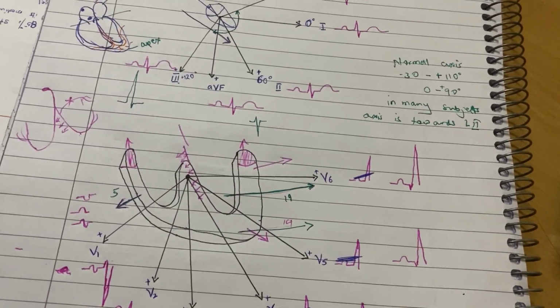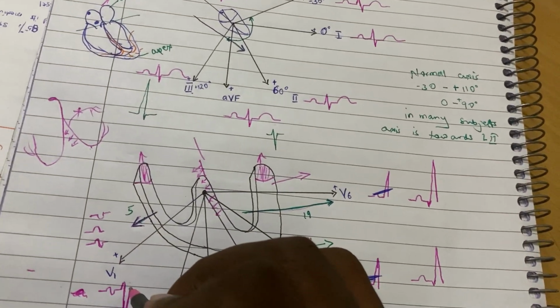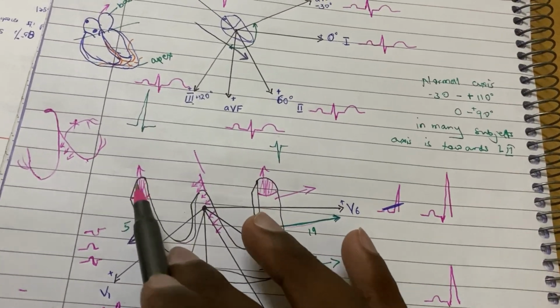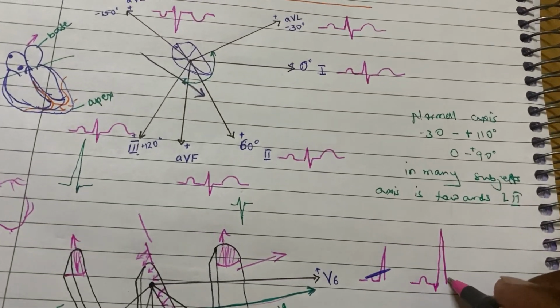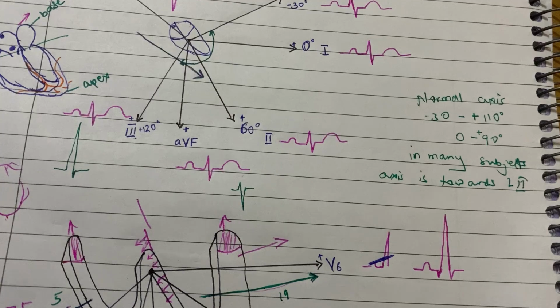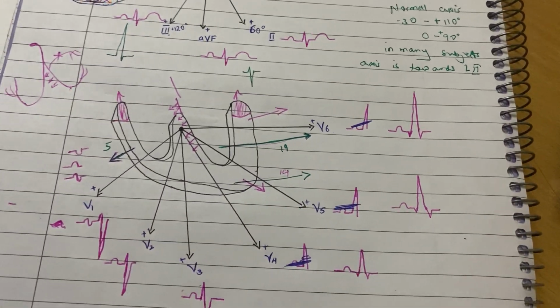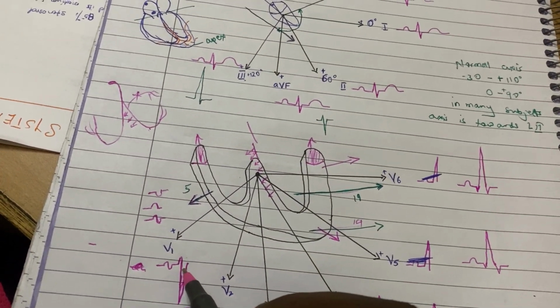It can appear because these ones are small, this is so small compared to this, it will appear as a very small S, and sometimes S is not there, because if it happens, it will be R, this side.